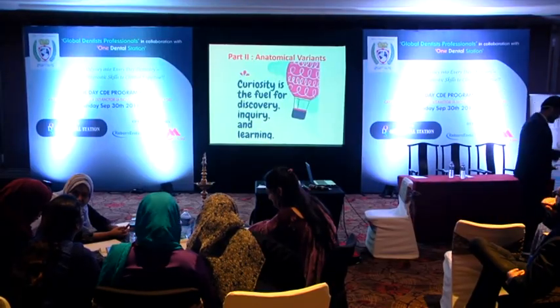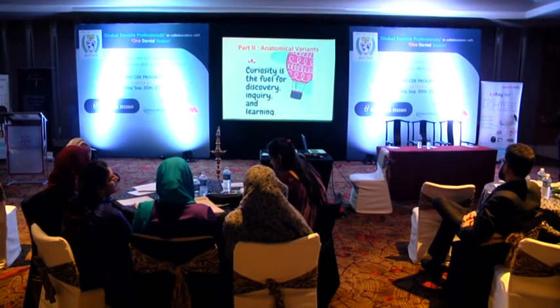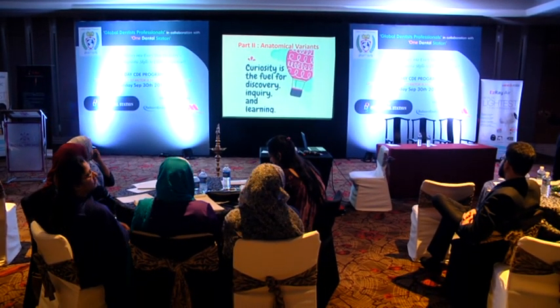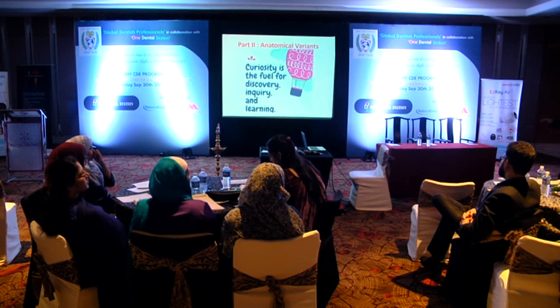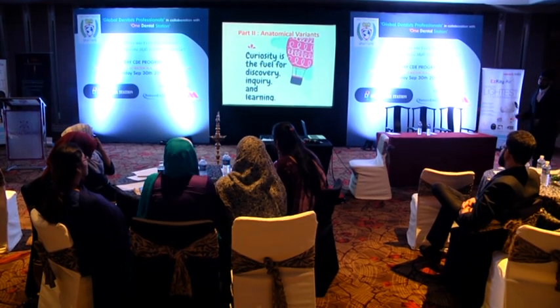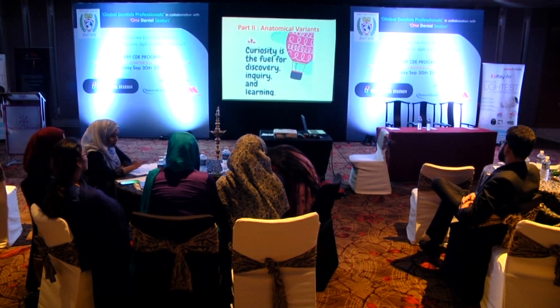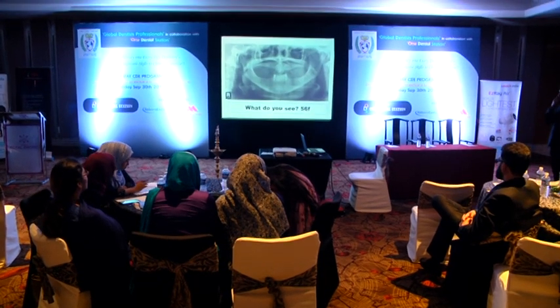Of the anatomic variations. Okay, this is more like an interactive session. In this, I think you guys are participating more than me talking on this particular presentation, right? Now, curiosity is the fuel of discovery, inquiry, and learning. With this in mind, let's progress. Now, what exactly do you see?